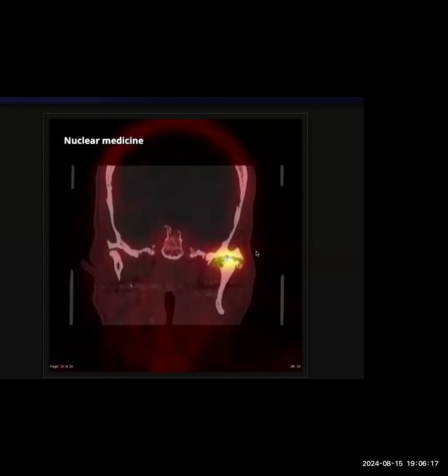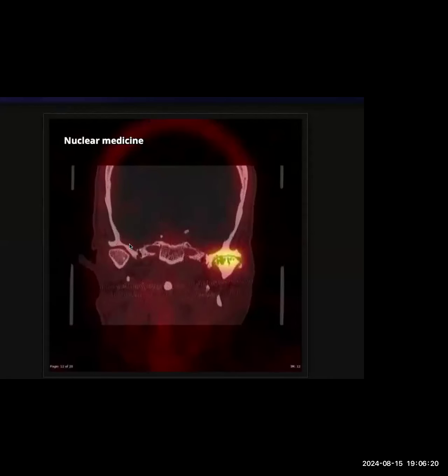I think this is a PET scan of the skull in the coronal views, which shows CT images and fused images, which show that there are erosions along the articular margins of the left temporomandibular joint with widening and broadening of the bones, narrowing of the joint spaces and marginal osteophytes. This represents changes of osteoarthrosis in the left temporomandibular joint. The right joint appears normal. And I would also evaluate this on the orthogonal images to look for any loose bodies or any other findings, and also on the soft tissue windows to look for any synovitis.